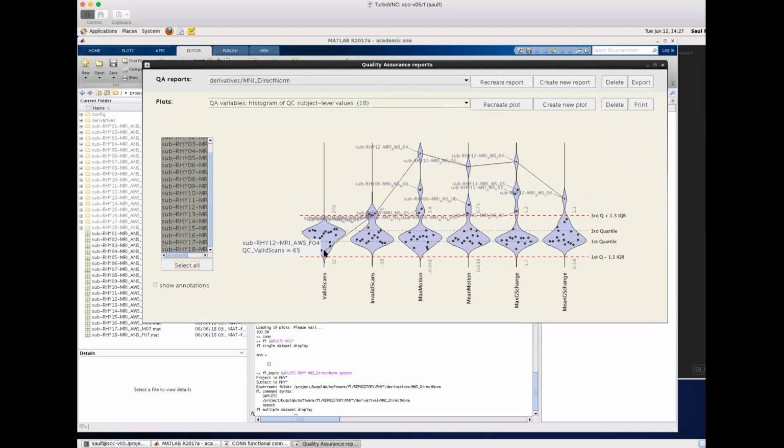This is one reason why the subject labels should be relatively small. Instead, in this example, we have very long subject labels, which makes all plots and all of these things a little bit more necessary. So the one subject we were looking at, RI06, it's among the lowest number.